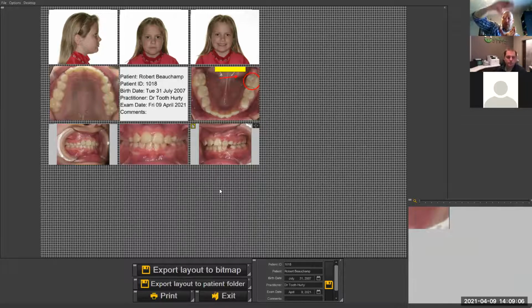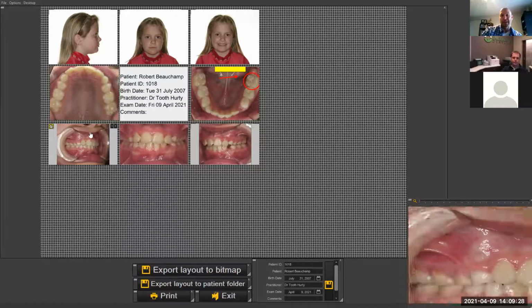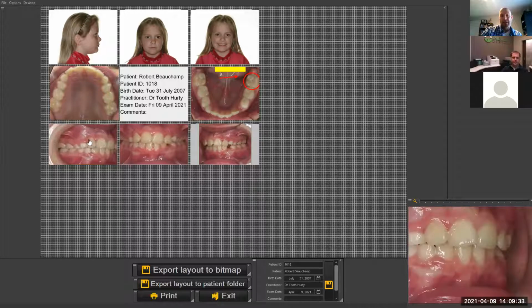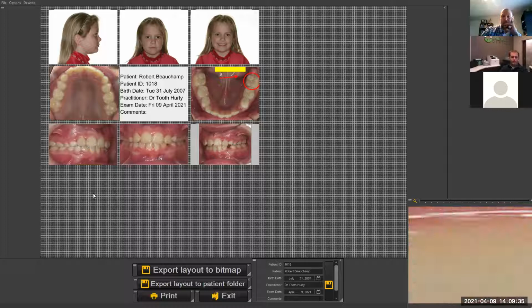And if you do take one for lengthwise purposes or whatever, in the computer, you can program that box to flip it a certain way. And you can program all that so that when they do download it, everything gets put in the right orientation. And then boom, if you just wanted to remove some of the periphery here, if you're taking with the mirrors and there's something you just don't like to see, the retractors here or whatever, that's where you would just zoom it up and make it a little bit more centered like that. So then it looks more professional.